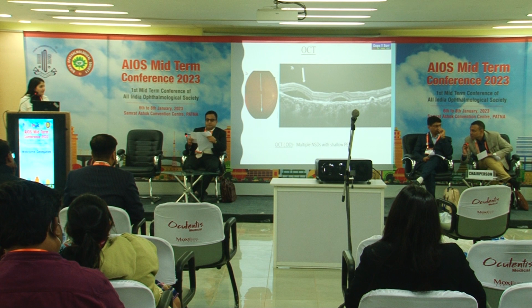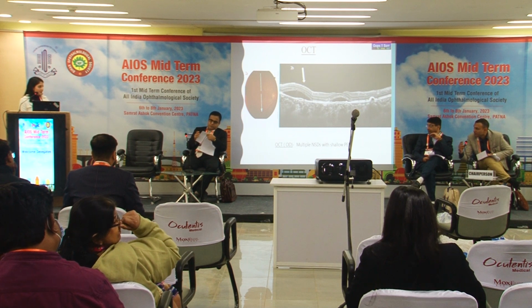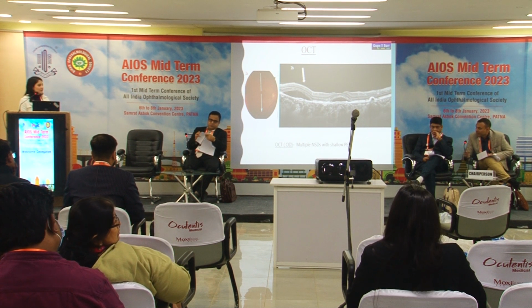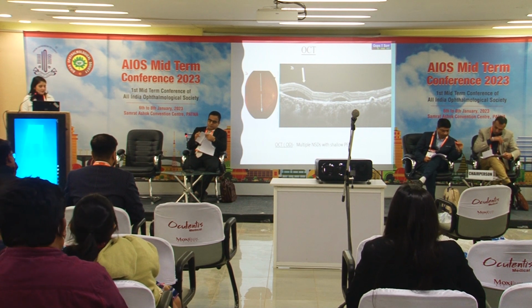Sandy, you said that it's not pachychoroid. Did you all measure the choroid? Did you all make measurements of the choroidal thickness? No. Looking at the OCT, it does look like pachychoroid, and we all know that now CSR is a part of the pachychoroid spectrum. Right, sir. That's something that you should also do, especially with such bilateral cases; it's a good idea to measure them. Sure, sir. Okay. Good, thank you.